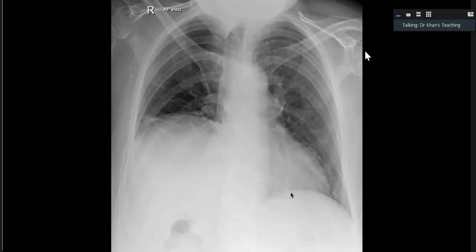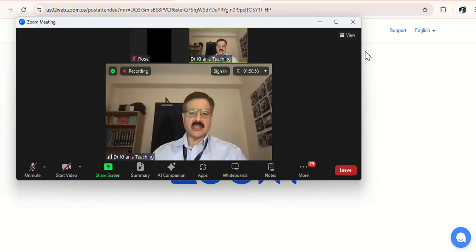And it is so simple that there is a right raised hemidiaphragm. You can see a bit of clips there. So this per se can be an exam type of film where the evidence is that there are some clips and you have to say that maybe previous surgery and raised right hemidiaphragm, you should be worried about phrenic nerve. And with the clinical history I have given you, that patient has developed dyspnea.